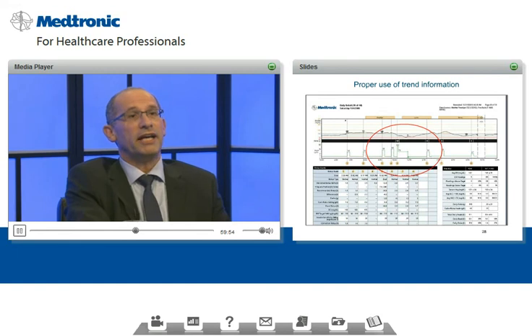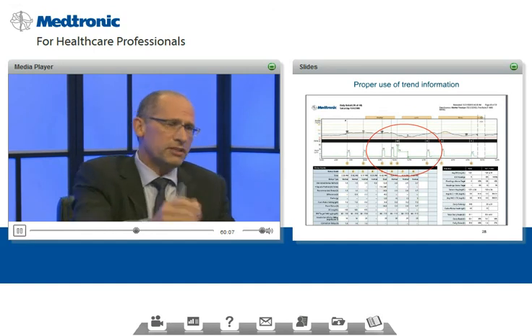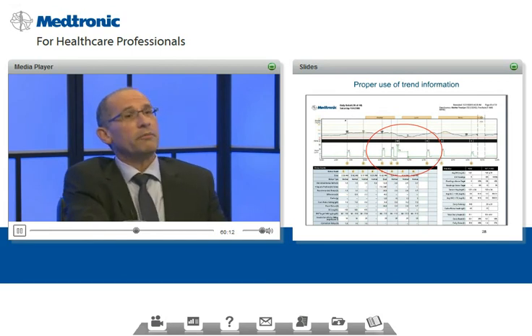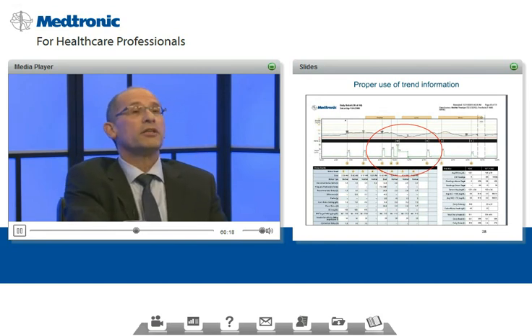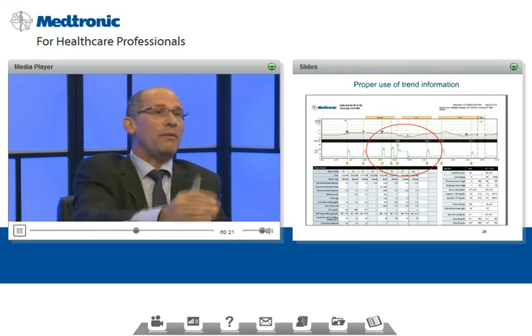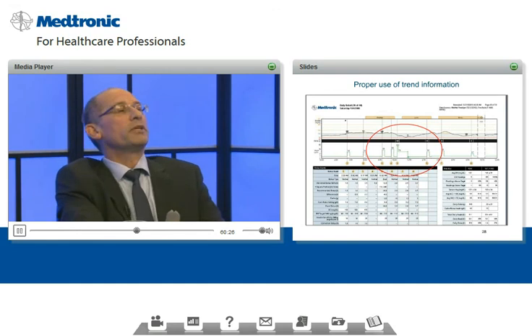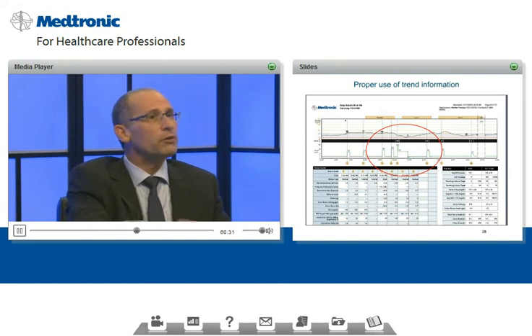In this circle, the patient had a meal, which, using the bolus calculator, advised him to use a high dose of bolus. Let's say, I think it's hard for me to see from here, but let's say it was 12 units. But the patient actually showed that the trend of the blood glucose before the meal is rapidly decreasing. So he uses the algorithm that we teach them, or uses his own common sense, that if I am eating but the blood glucose is trending down, maybe we should decrease a bit the amount of the insulin that was recommended by the wizard, and that's exactly what he or she did.